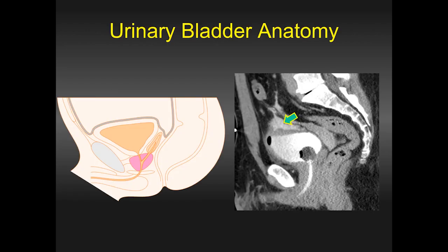treatment. And so when we talk about urinary bladder, the urinary bladder is the most distal conduit which receives the urine from the ureters. And if you look at the sagittal image of a male pelvis, you can see that the dome of the bladder is lined by peritoneum, but the bulk of the bladder is essentially extraperitoneal. And you can see this anatomic fact in the sagittal reformatted CT image, where a CT cystogram has been performed and there is an intraperitoneal leak that is leaking into the peritoneal space overlying the bladder.